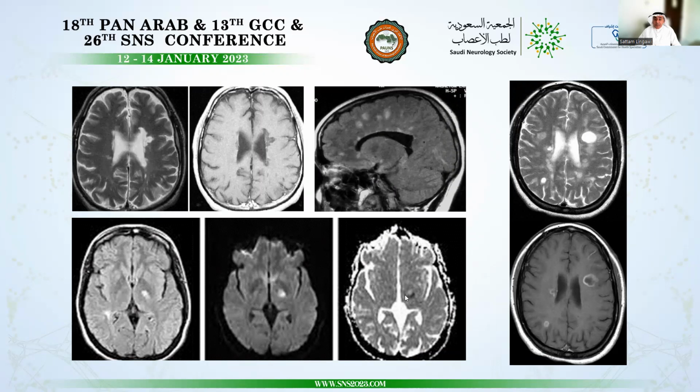The lesions may demonstrate restricted diffusion in the acute phase in active disease. They may also involve deep white matter in the internal capsule, sometimes even identified in the thalami, as thalami also involve a smaller percentage of white matter tracts.